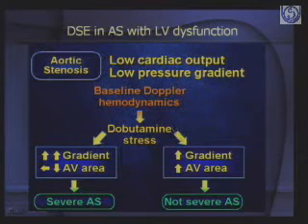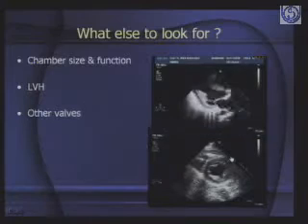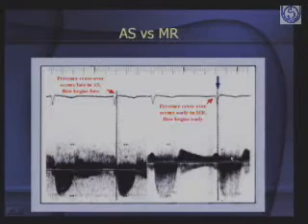But if you go on the other side, that yes, the gradient increases, but also the aortic valve area increases, then of course it's not severe AS. This is the point you were making, right? Yeah. We already answered it. Okay, so then moving on to aortic regurgitation.